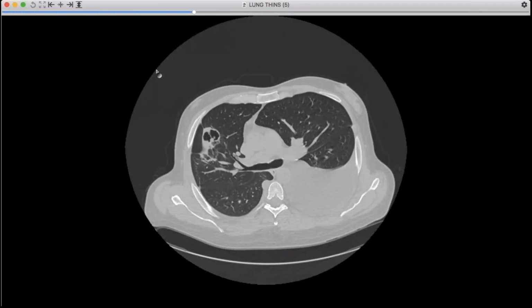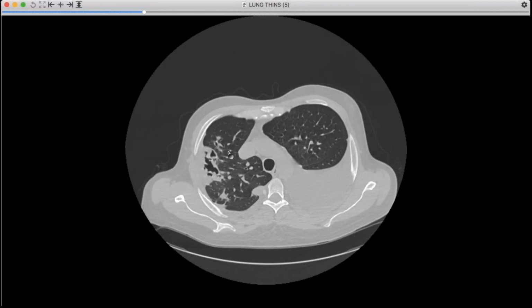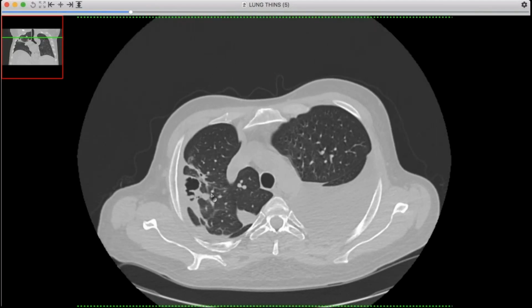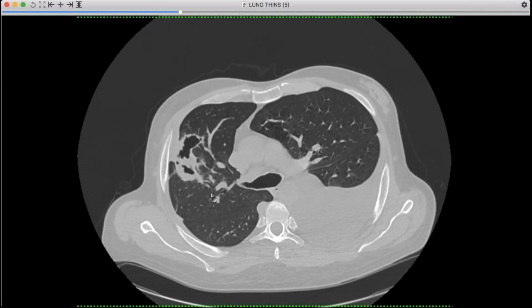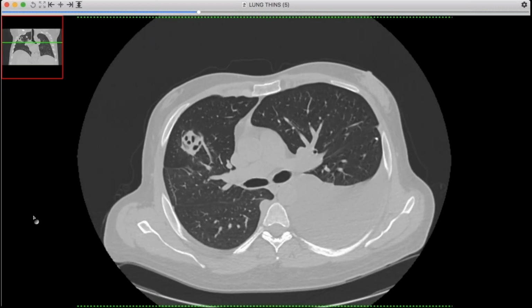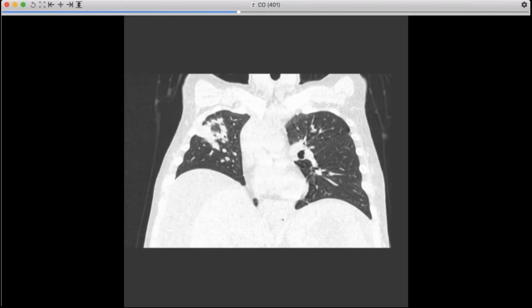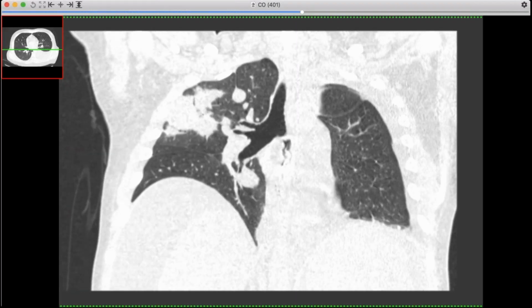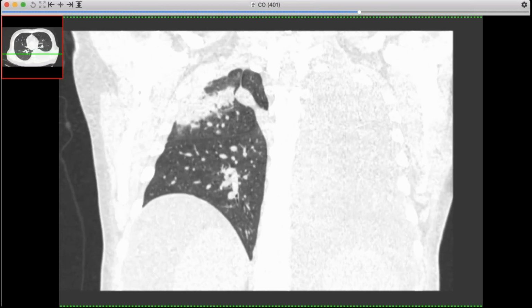Which I usually think of forming large nodules. And this one, as you can see, as it responded to antifungal treatment, it sort of coalesced into one big cavitary mass, which you would see maybe more with Cryptococcus. But I don't recall seeing a lot of cases of crypto that were more consolidative without more discrete nodules. I don't know if anyone else has similar experience.